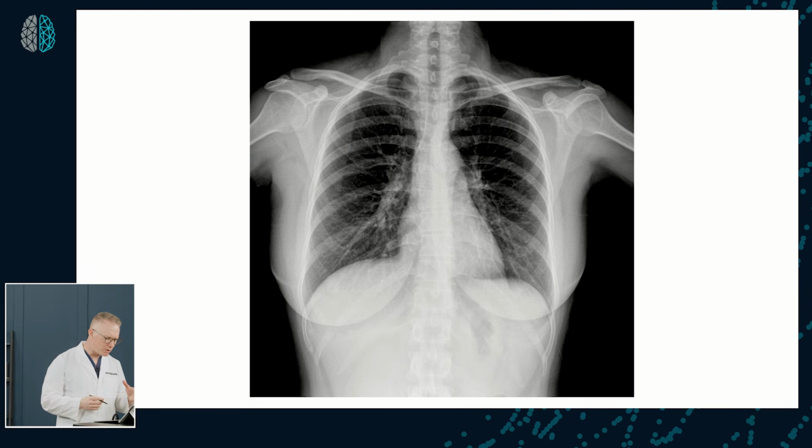So now we move on to step 2. Okay, step 1 was you determined that the image quality was appropriate to interpret. Step 2 is now let's start, and most people tend to trace the right side or the right border first. Now remember, this is the right side of the patient, and this is their left side. So you've got to keep yourself oriented to their anatomical positioning. So the right side, if you're looking at it, you're going to see the superior vena cava at the top, and that's this area right here.